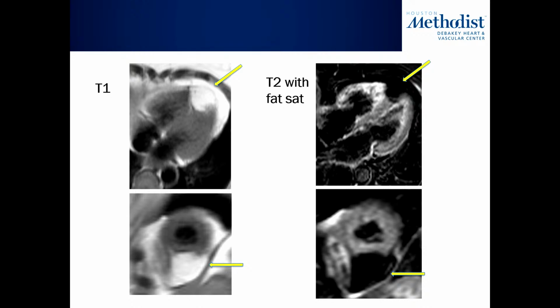Here was a structure that was bright on T1. And then when you did your T2 images with fat saturation, you can see this image is dark. I don't expect y'all to know MRI, but maybe, if you've been aware in the last quite a few lectures that we've had, tissue MRI is actually assessing intrinsic properties of the myocardium, physical principles of the myocardium.